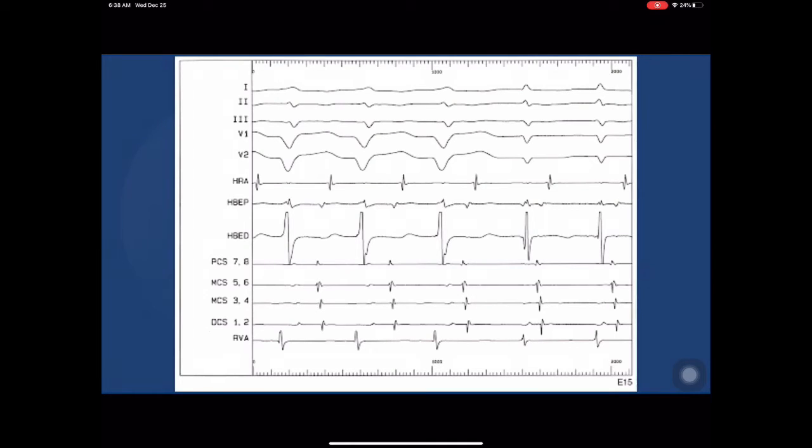you need to do. Anytime you get a complex situation like this, you need to make multiple measurements. So put your calipers, you can take any A's you want, put them on the higher A and just march them through, or march through the coronary sinus leads, and you'll see they don't change. So they're not changing. So whatever's going on above the AV node is constant.